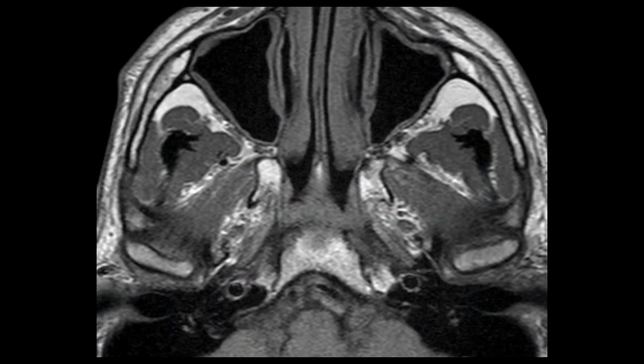This is an axial T1 pre-contrasted image. I look at this and I see that the turbinates in the nasal mucosa are very dark. So I remember that the nose knows. So I know this is a pre-contrasted image. But it's very important when I look at all the fat and the retromaxillary fat pad and the fat marrow within the bones, the condylar head and the pterygoid plates and the central skull base, if I have replacement of that fat, it's very important for a lot of the pathology in the extracranial head and neck.